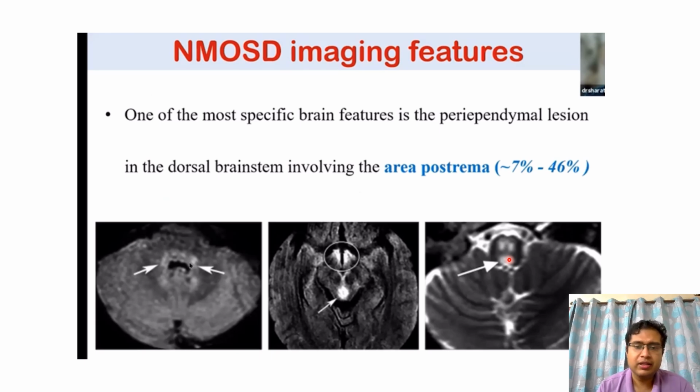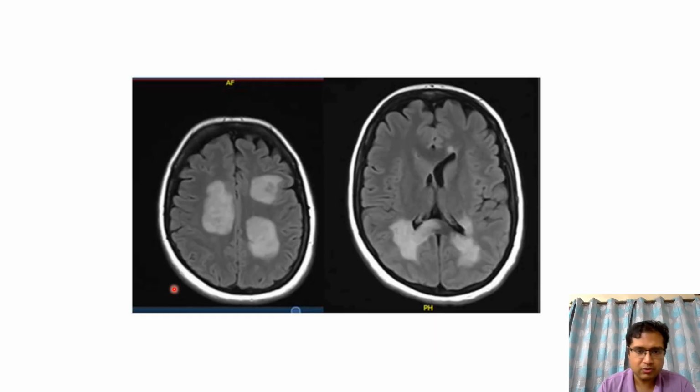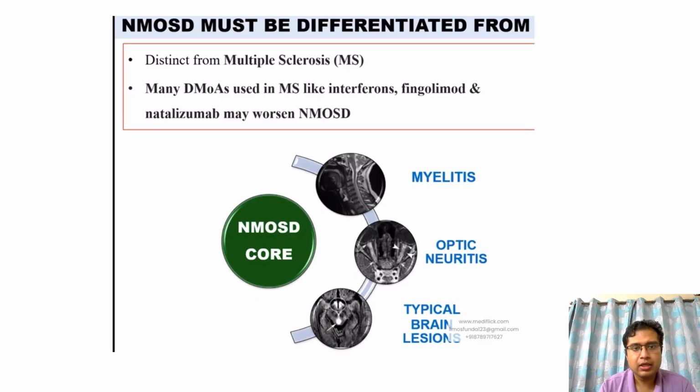and he'll be frequently visiting the gastroenterologist, who will be prescribing antacids and doing endoscopy with no significant improvement in the condition. In such cases, if the clinical profile fits, we should definitely get an MRI brain done to look for any demyelination in the area postrema. So this is one of the types of lesions that can be seen in NMOSD, more than 3 centimeter in the white matter bilaterally, which is relatively rare.